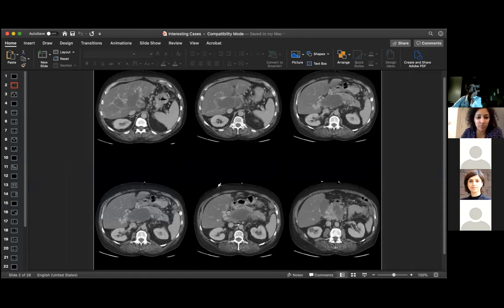Yeah, so Kedar says portal venous clot. Tammy also says portal venous thrombosis. Okay. I'm wondering if that is a pseudocyst that is ruptured into the portal vein. Mm-hmm. Okay, perfect. Anything else on the axials that's jumping out at you, like the bottom set of images here? Definitely like cavernous transformation. That bottom right image looks a little funny. Like, is there a mass in the pancreas?